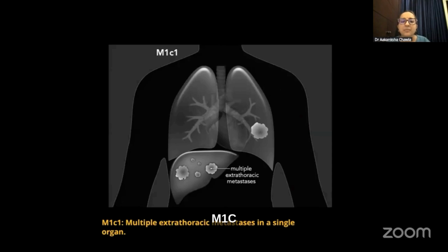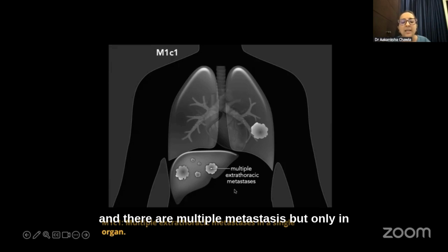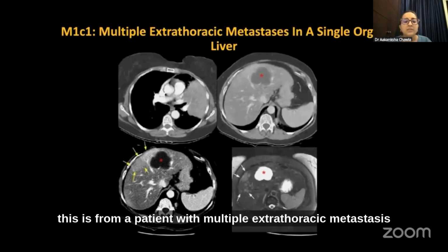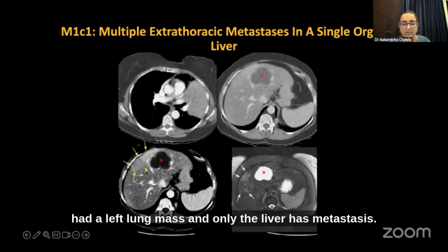Now, M1C has M1C1 and M1C2. M1C1 means multiple extrathoracic metastasis in a single organ. As you can see, the tumor is in the left lung and there are multiple metastases, but only in the liver, nowhere else. This is from a patient with multiple extrathoracic metastasis in a single organ, only in the liver. The patient had a left lung mass and only the liver has metastasis.